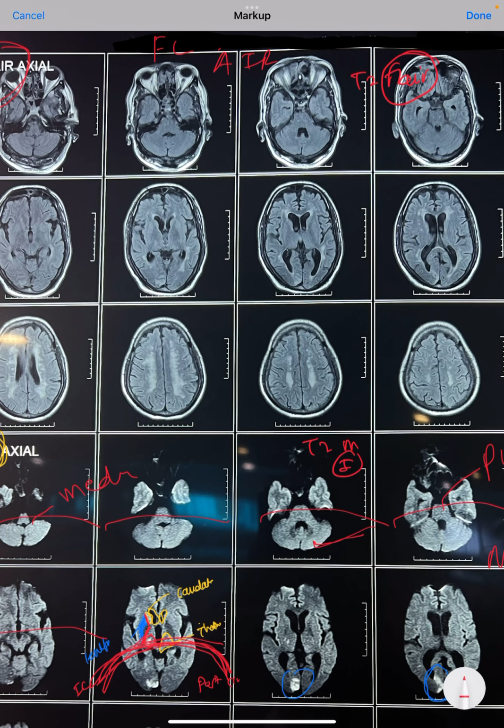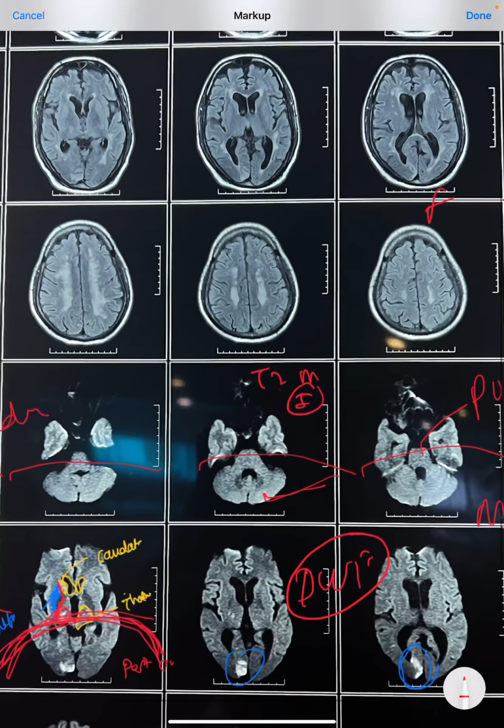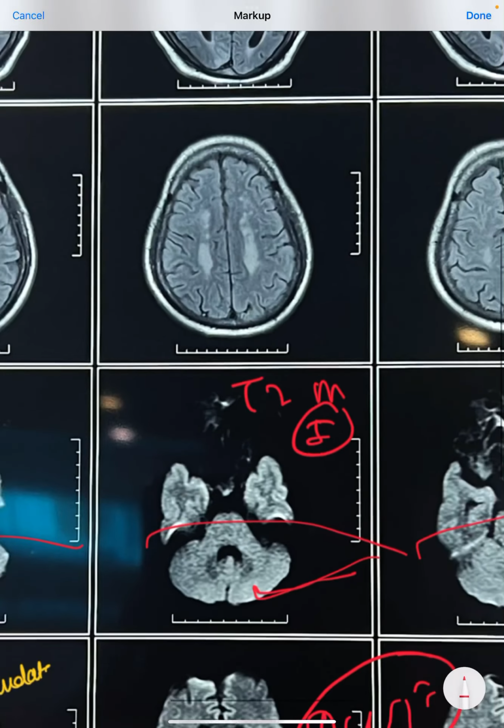So it will definitely pick not only new ones. DWI will pick only and only new ischemic strokes, so we may not know the old ischemic stroke, but this FLAIR will tell all the new as well as old lesions. There is one benefit of it, that we can see that the patient has extensive bilateral periventricular ischemic changes. These will appear hyper intense or dense white.